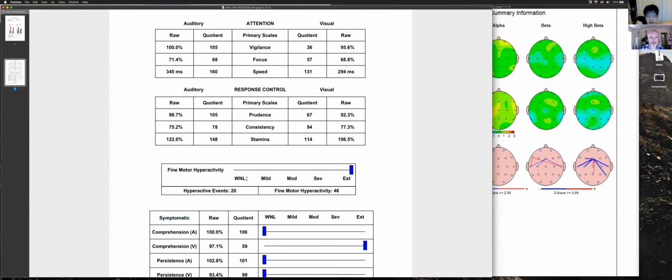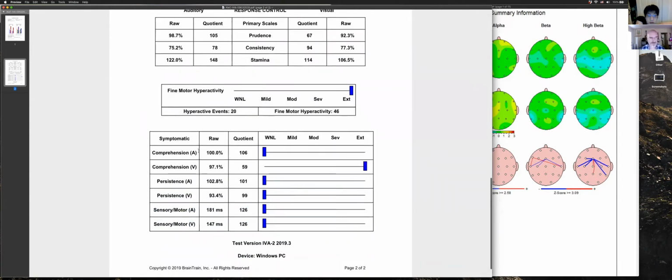And then we have comprehension, which was fine at the beginning, but by the end of the test, you were like, yep, come on. You tried to click through it a lot. You got really impulsive at the end of the test. It's not comprehension for an adult. It's just getting clicky during the instruction blocks or the cool down block. Probably a cool down for you here because you were kind of done.